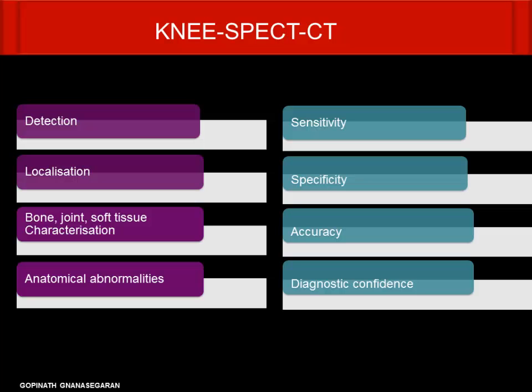So if you see an uptake in the medial aspect, and if he's had a particular surgery, then the orthopedician knows that's the normal uptake. You may think it is abnormal, but for an orthopedic surgeon, because of the type of surgery done, that is where the patient is going to put stress, and that is a normal biomechanical stress. So therefore, unless you have a chat with your orthopedic surgeon, bone SPECT CT, especially in post-arthroplasty, will be challenging.